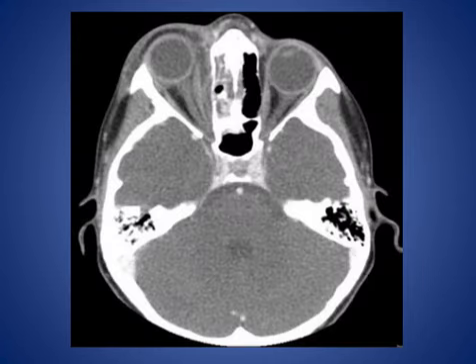Next case. This is a 9-year-old child with eye pain. As we see here, this is an axial CT scan at the level of both orbits, and we see proptosis of the right eye, and there are edematous changes around the right eye. And here we see there is a subperiosteal abscess and osteomyelitis of the lamina papyracea on this side, associated with orbital cellulitis.